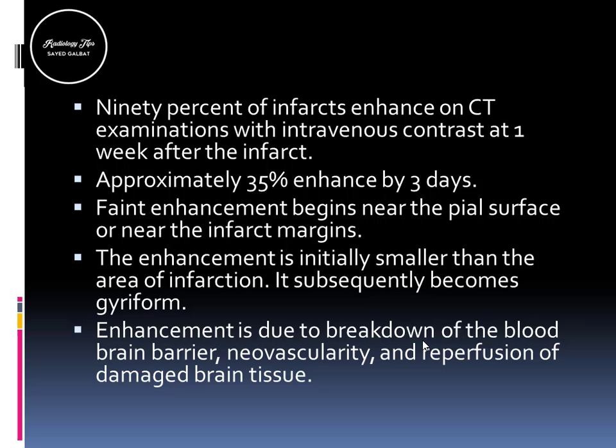Okay, so 90% of infarctions will show this pattern, gyral enhancement, after 1 week. 90% of infarctions will show this pattern of enhancement. On the other hand, only 35% will enhance by the 3rd day after the onset of the symptoms. So in the chronic phase, you won't expect to see enhancement in the post-contrast study. And similarly, in the acute and hyperacute stage, you won't expect to see much enhancement. You may see some patchy enhancement in the substance of the infarcted area, but the characteristic gyral pattern of enhancement, you will see it in the subacute stage only.